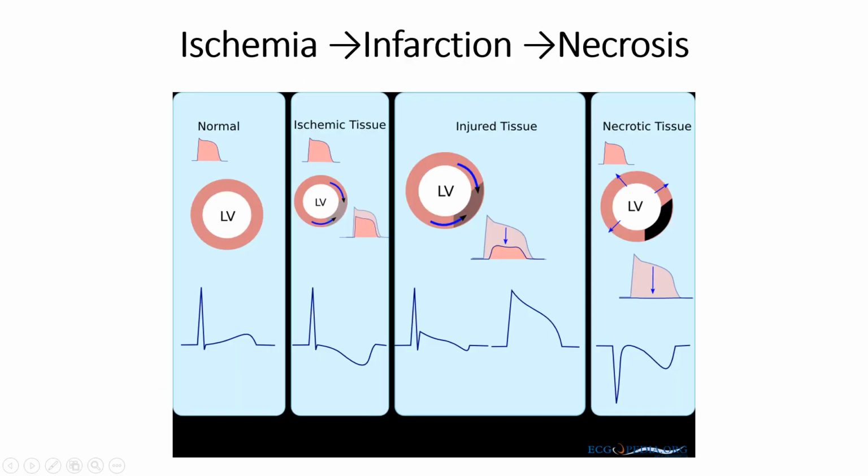In terms of electrocardiography, we can see here that in the normal perfused heart, we have a QRS complex and then a T wave. In the case of ischemia, if any EKG changes are present, they are likely to be something along the lines of ST segment depression and/or T wave inversion. If that reduction of blood flow is severe enough, then it can reduce blood flow to the entire full thickness of the heart, which is going to manifest with ST segment elevation.